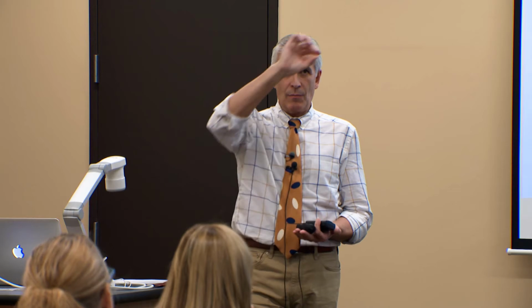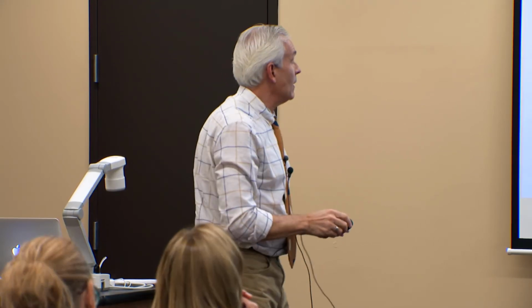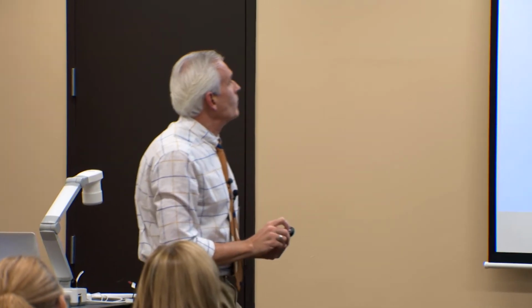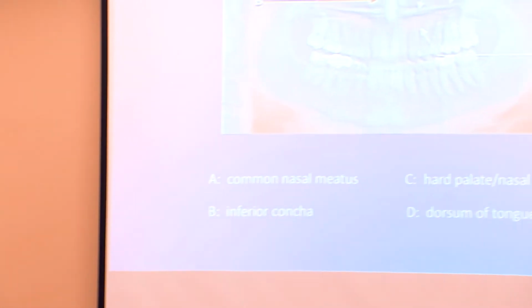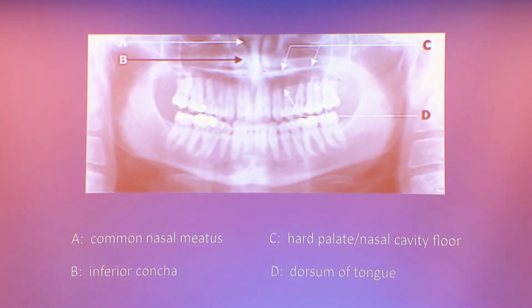Primary here, ghost here. Primary here, ghost here. So the image will often end up looking like a series of horizontally oriented parallel opaque lines. I think I will have some other images that are better to show you that.